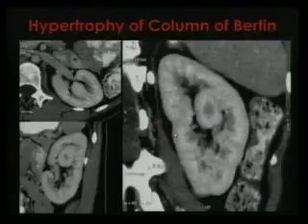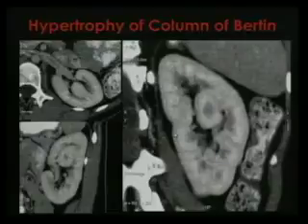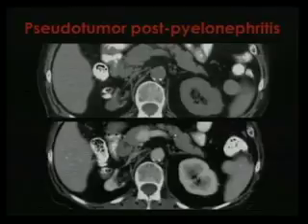This patient came to CT with a question of a left renal mass on ultrasound. Another pseudotumor, as I said, can be focal hypertrophy of the kidney, and that's what happened in this patient. We have an atrophic kidney with an area of probably asymmetric vascular supply, keeping part of the kidney with normal caliber. This was proven as benign.